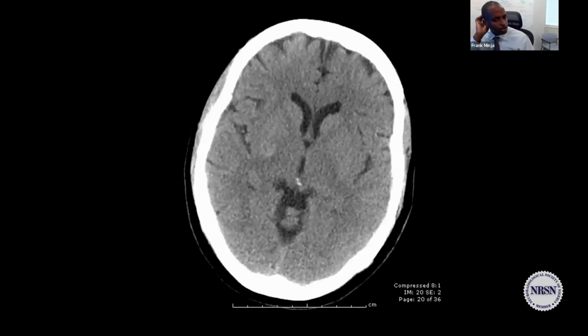Again, they're extremely common. Here's a nice one on another patient where you see it here in the right basal ganglia, this sort of hyperdensity. Remember, basal ganglia calcifications tend to be symmetric and they tend to be in older patients. So when you kind of see this sort of subtle asymmetric calcification, please think, is there potential that you're dealing with an underlying vascular malformation?